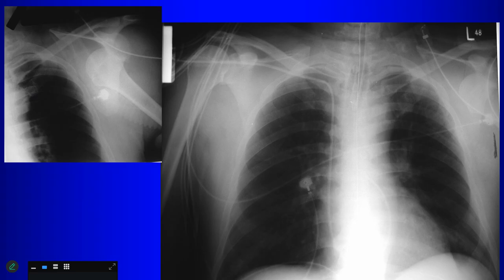Shoulder dislocation, right? And these are common, especially in trauma cases. This patient was in the ICU at the edge of the film. So to be systematic, you look at lines and tubes, heart size, the lungs, the bones, the edge of the films. And that discipline is what keeps you from missing important abnormalities.